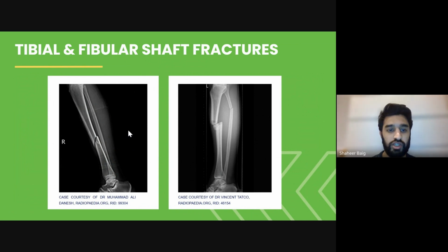So usually when you see a fracture in either the fibula or the tibia, the other bone will demonstrate a fracture or dislocation. It's not quite clearly seen here, but I suspect there's some sort of injury in the distal fibula or the proximal fibula accompanying this oblique tibia fracture. And then also you can see here there are definitely transverse fractures of both the tibia and fibula.